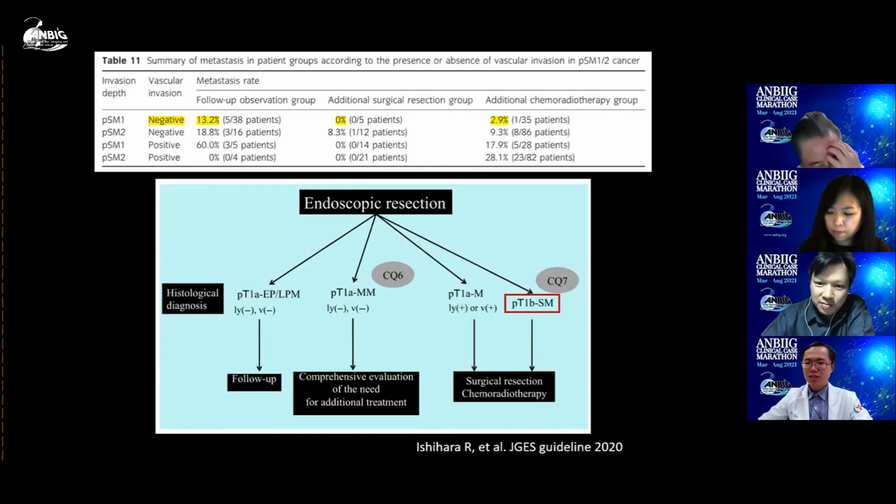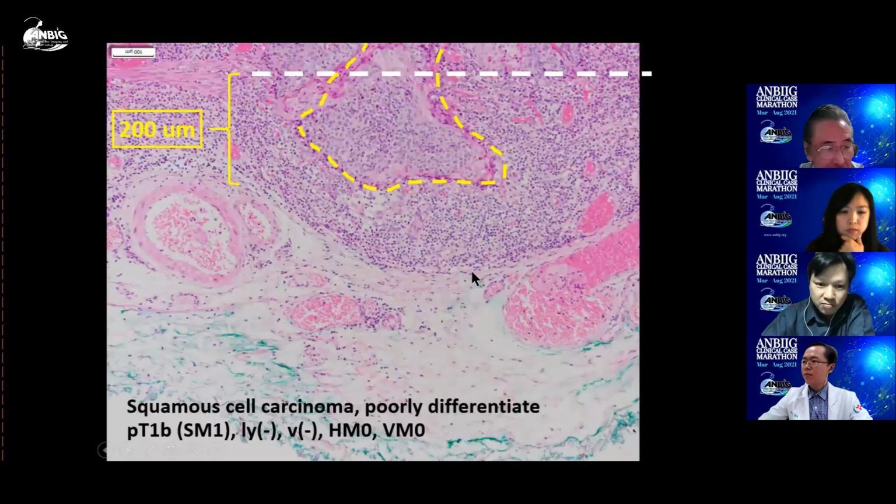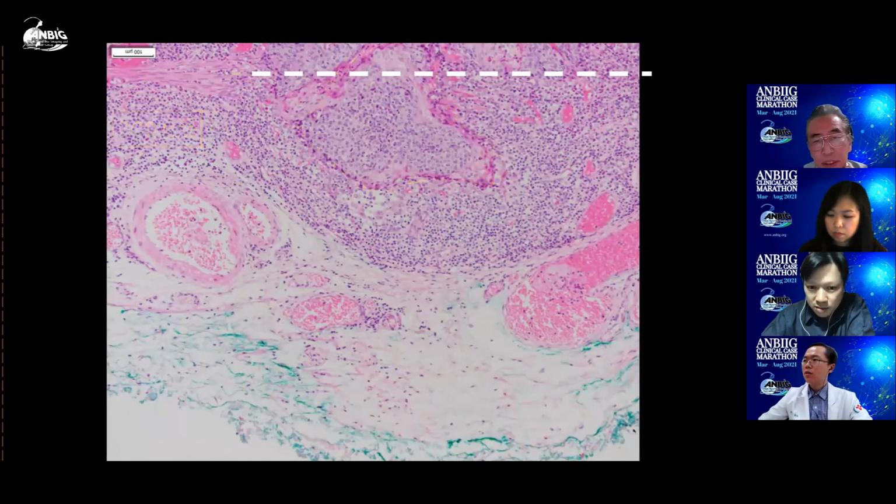Yeah, it's always very difficult. So in this case, pathology demonstrates a poorly differentiated cancer, the true G3, purely poorly differentiated cancer cells. The yellow line is here, but I think it is covered with some reaction, so it's very difficult to evaluate.